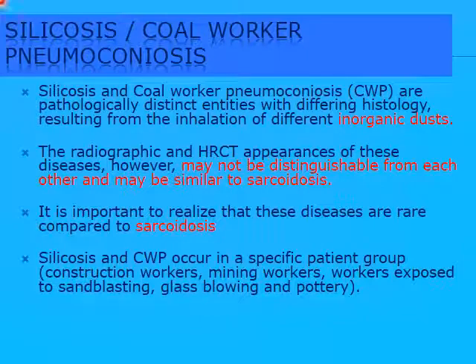The disease number 2, silicosis and coal worker pneumoconiosis. This is a large subject that you can read a lot about, but let us summarize the findings here.